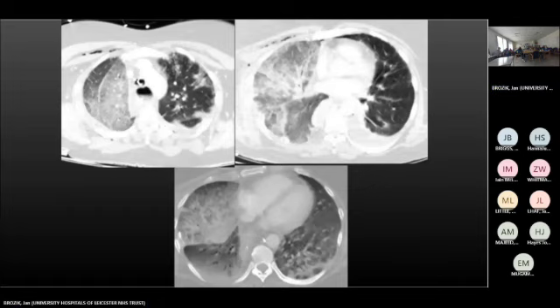Is it an azygos lobe? Well, it's similar, but it isn't. It's just too big. It's a fissure. The question is, should that fissure be that high? There's something wrong. Everyone described it, and we have abnormality, we have septal lines, ground glass opacities, consolidation.